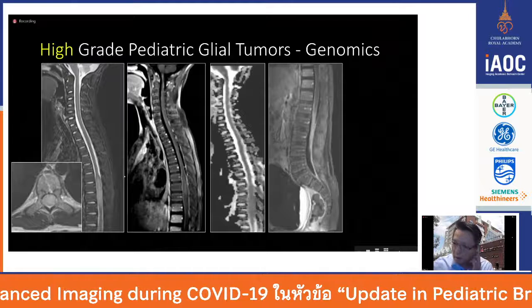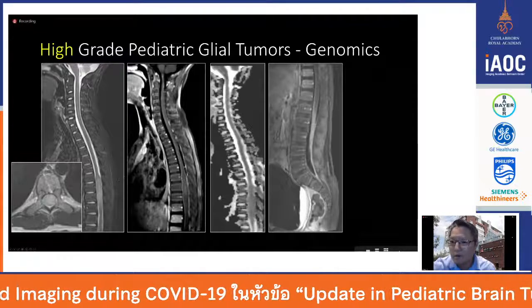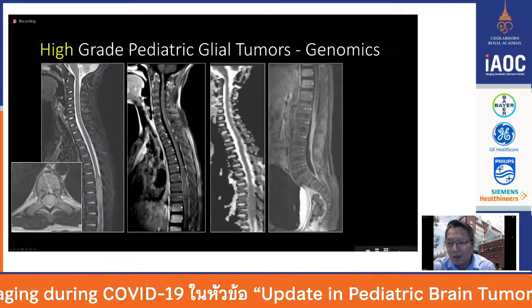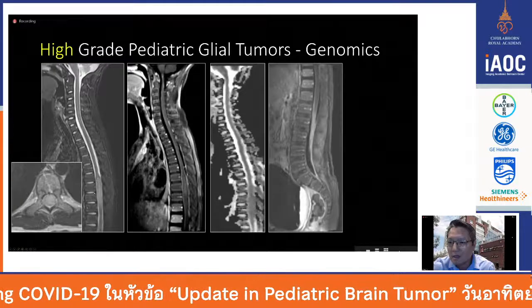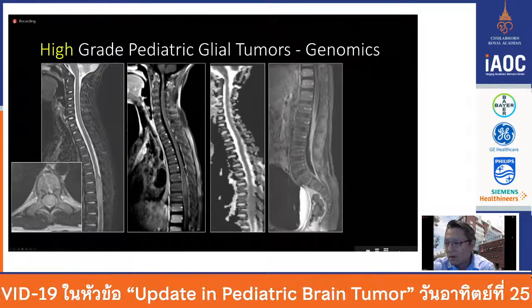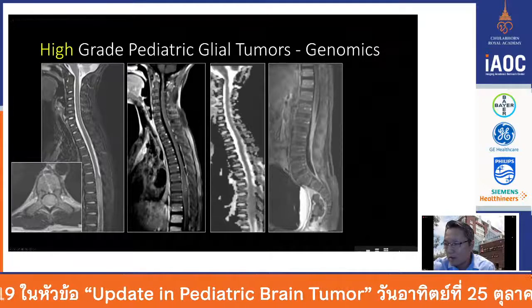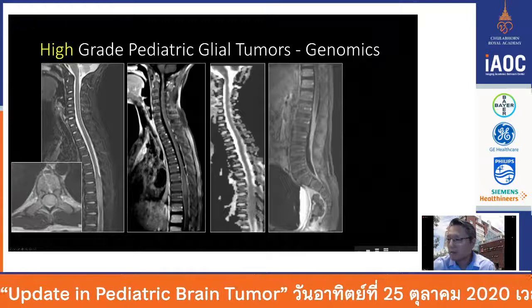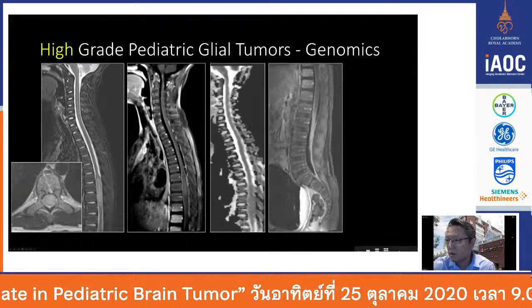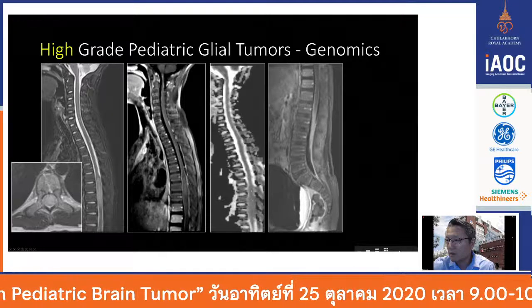All right, here's another glial tumor, again, spinal cords in the CNS. So this one caused expansion, T2 hyperintensity of the lower thoracic cord. We can see on post-contrast, maybe there's a little faint enhancement, not a lot. And here's an ADC map actually of the spinal cord. Looks about the same as the rest of the cord, so not high, not low.